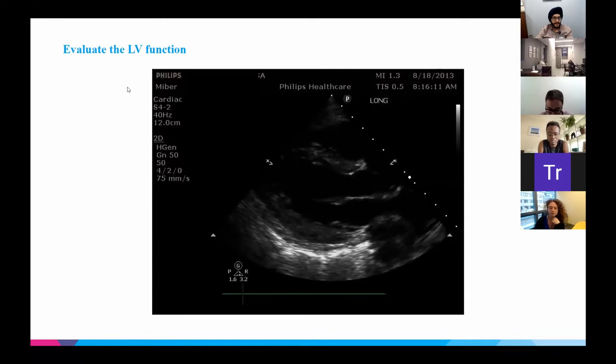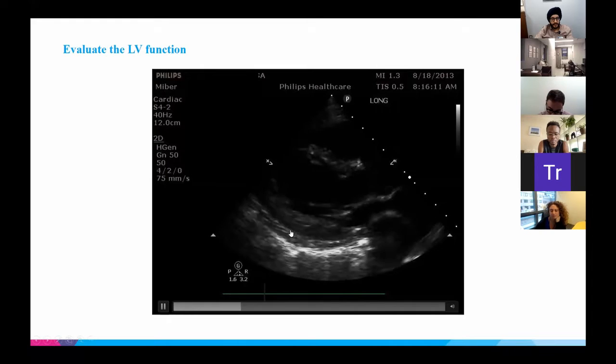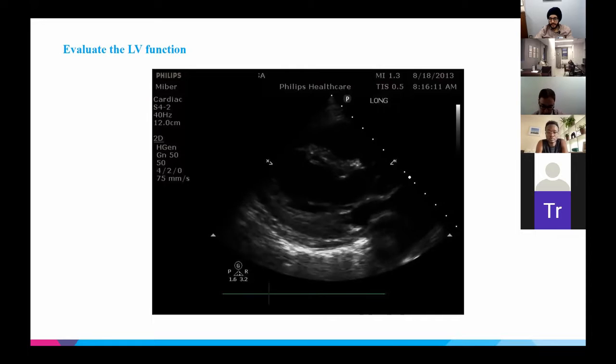All right, so this is more disagreements, which is great. It shows that this is the challenge that we face sometimes, right? So this one's tricky, I would say, but it looks like the majority was deciding between normal versus reduced. So I guess, can someone... huh? EF 40% is what I heard.